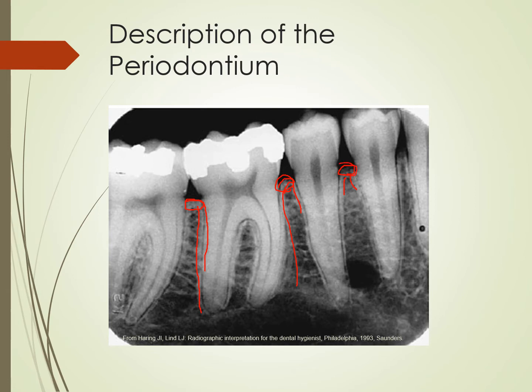This alveolar crest, well, we're seeing a little bit of a darkening to it. So this is an area where that person actually might be beginning to have a little bit of inflammation. Even though this is an example of a healthy one, it's okay. It looks like they've been through some things here. They've got a couple fillings.